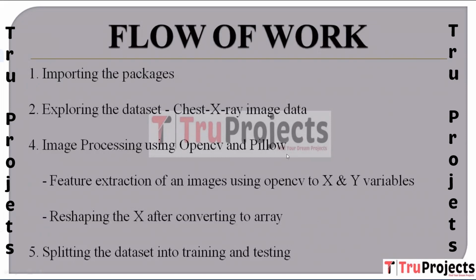Next, we have image processing using OpenCV and PIL. Utilize OpenCV and PIL for processing chest X-ray images. This may involve extracting features using OpenCV, converting images to array, and reshaping the data.